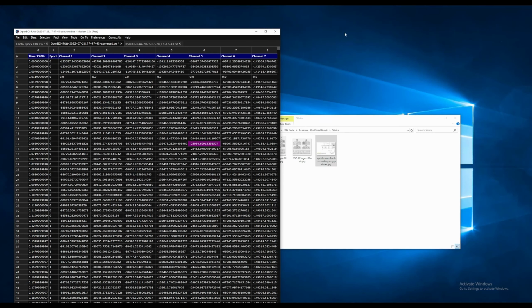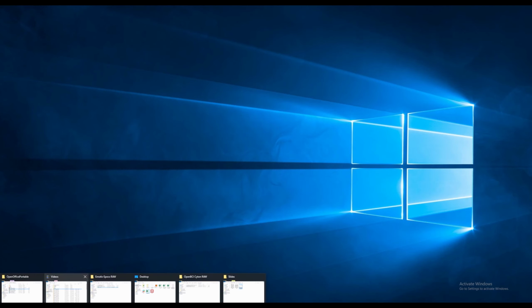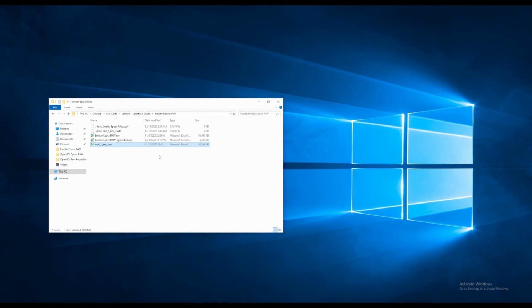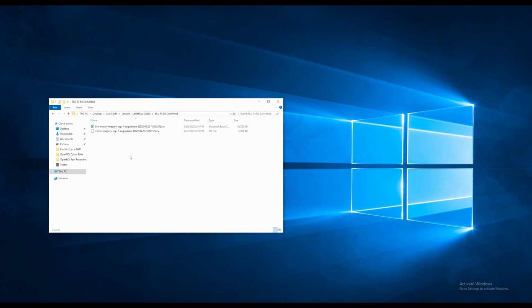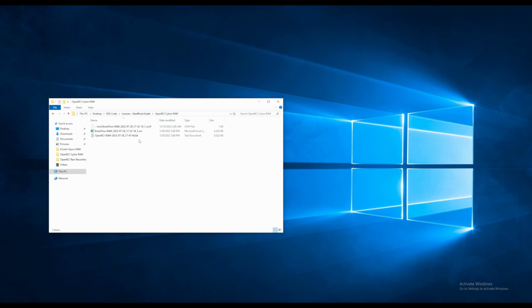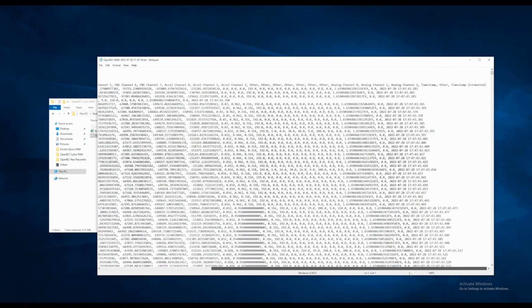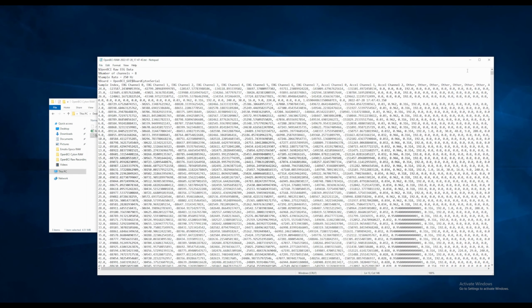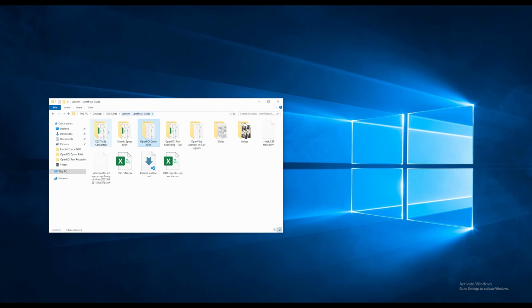And the files that we're going to convert are these two long recordings from two different motor imagery recording scenarios. One is recorded using the Emotiv Epoc X. And let me copy it here. And the other is recorded using the OpenBCI system, which is, if I'm not mistaken, recorded using OpenBCI's own GUI. So we're also going to copy this.